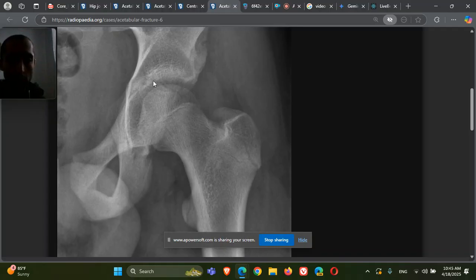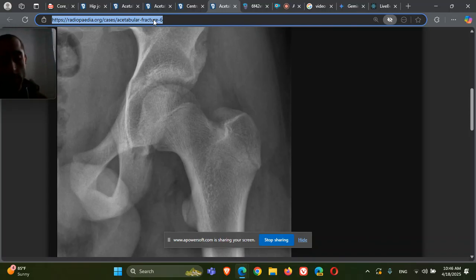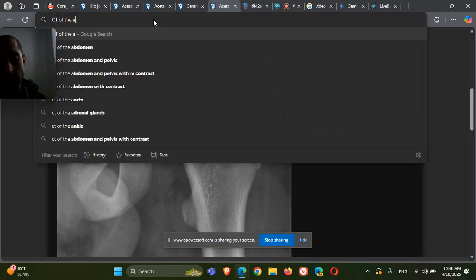The roof may also be disturbed. And this is important to note. This is why it is important to note those lines. So great, we touched on the lines of the hip landmarks. Now let's look at the acetabulum.